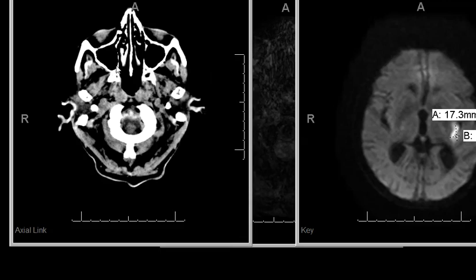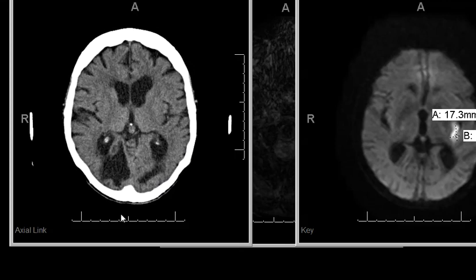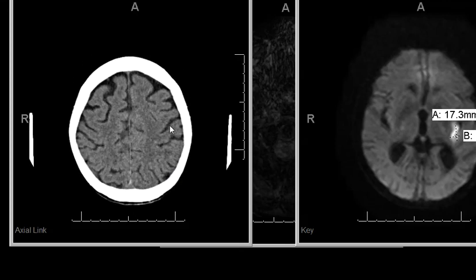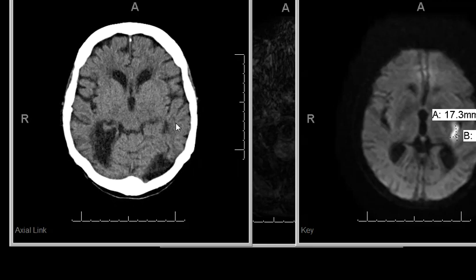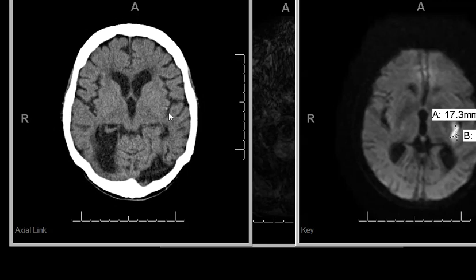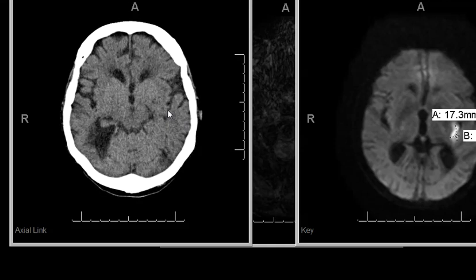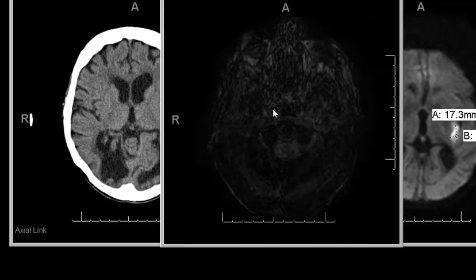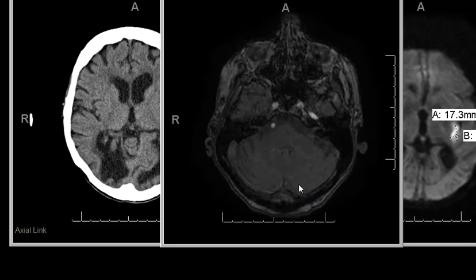This is an 80-year-old with altered mental status, old stroke in the bilateral occipital region, and that's pretty much it. We did not call anything else on the CT, but in retrospect we should have been more attuned to this hyperdense region of the M2 segment of the middle cerebral artery that was verified on MR angiogram obtained a day later.